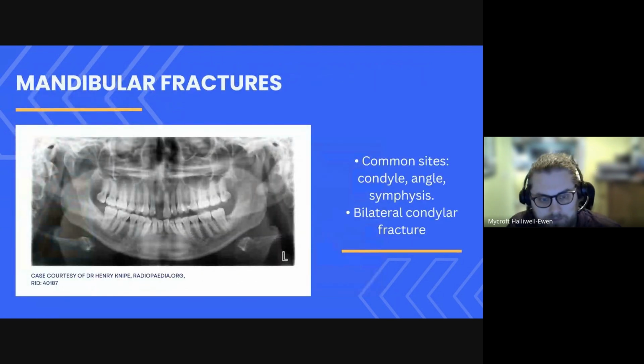Right. Should we do some fractures? Good. Same as the face. Right. Fractures tend to come, right, at sites of weakness, right? So you tend to see them in similar places, but they also need to match the forces applied to them, and you can get quite a lot of different forces applied.